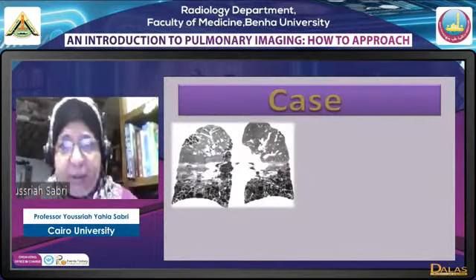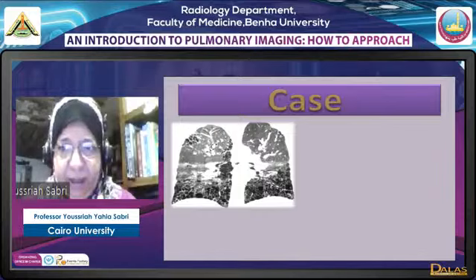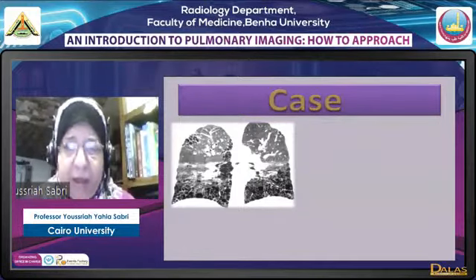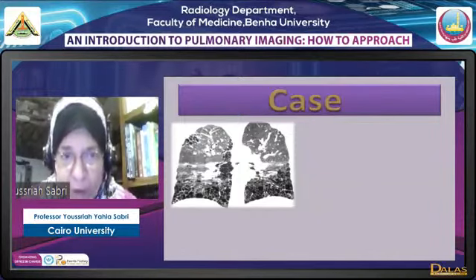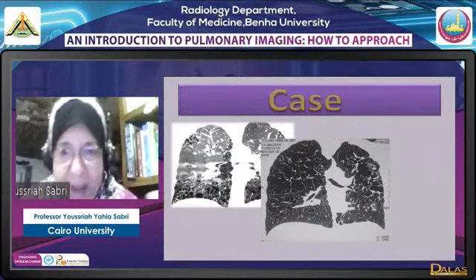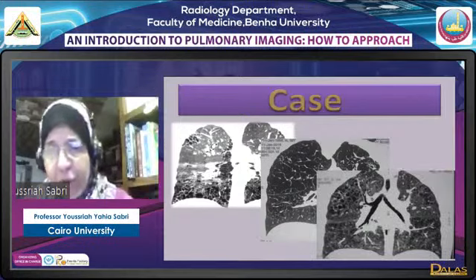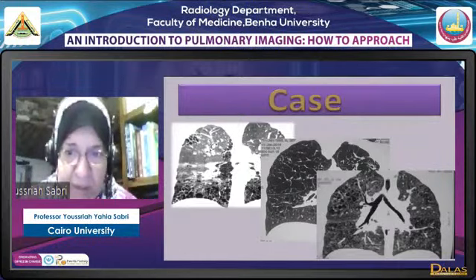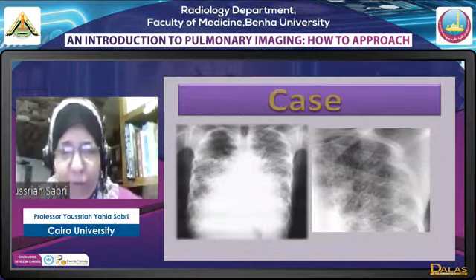Now coming again to the cysts. So we have finished with dots, micronodules, we have finished with strands, prominent inter and intralobular interstitium. We have finished with classic distribution of some patterns of ground glass. Okay, now going back to cysts again, we have the classic subpleural predominant clusters of cysts in honeycombing, and the classic upper lobar bizarre shaped cysts of pulmonary Langerhans, and the classic diffuse cysts in both lungs with an otherwise normal lung in females with LAM. Now in this case, what do we have here? We have a diffuse bilateral disease.